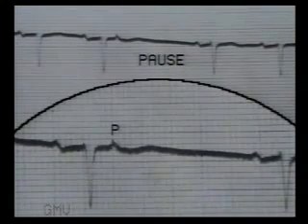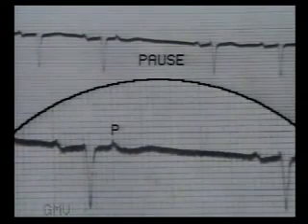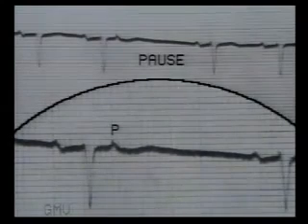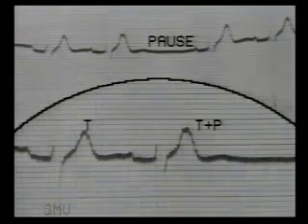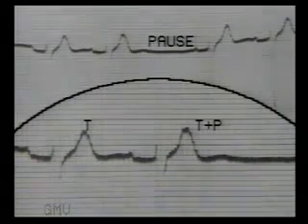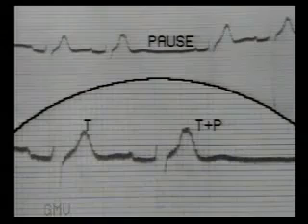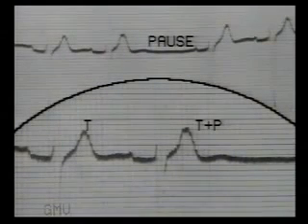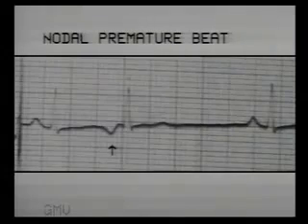It looks exactly like sinus pause, but the last T wave shows a dent or alteration. This also means that to diagnose a sinus pause, the previous T wave contour should be normal. In this tracing, note the change in the shape of T wave due to P wave of the non-conducted atrial premature beat. Only close observation will tell that this is not a sinus pause.